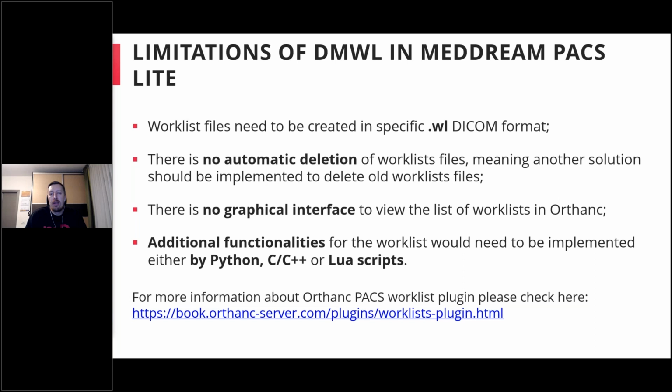And if we talk about the limitations of the DICOM modality worklist in the PACS Lite, as you saw, the worklist should be created in the very specific WL DICOM format. And unlike the PACS Premium, where the ini file is imported and deleted from the file system, here with this Orthanc plugin the worklist files are not deleted. They are stored in this folder, and that's it.